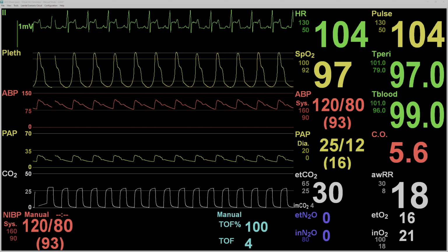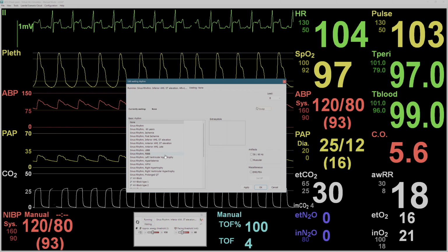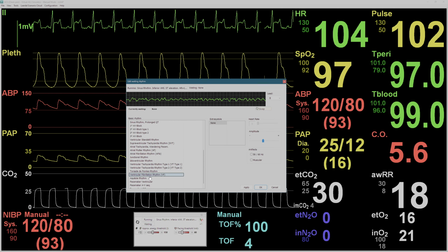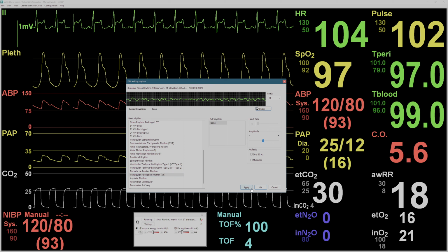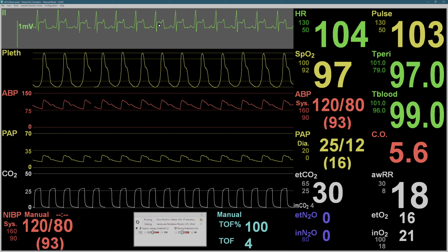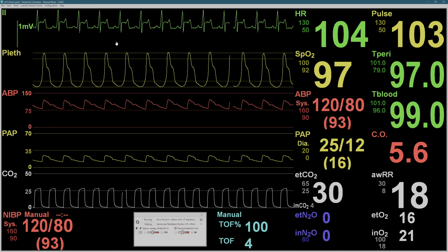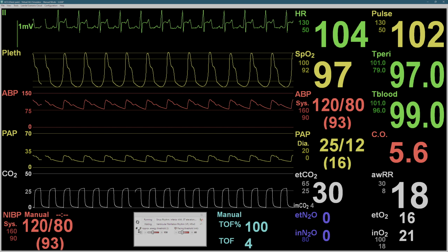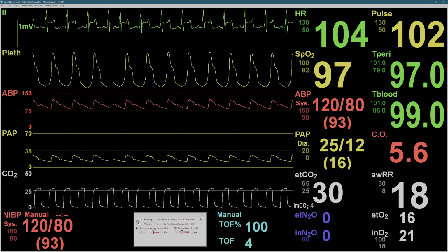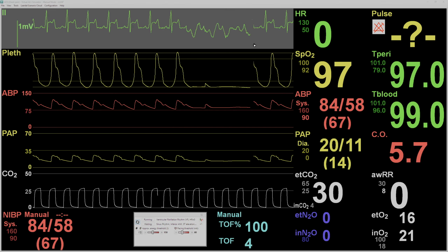But with the rhythm generator, I'll pull it up here. I can show you. I go to waiting. I can put in ventricular fibrillation, apply, okay, and then whenever I'm ready, I can switch the rhythm. So currently I'm in sinus rhythm with elevation in lead 2. Obviously this is non-diagnostic. Switch it out and it'll switch to VFib. Now the patient's in VFib.